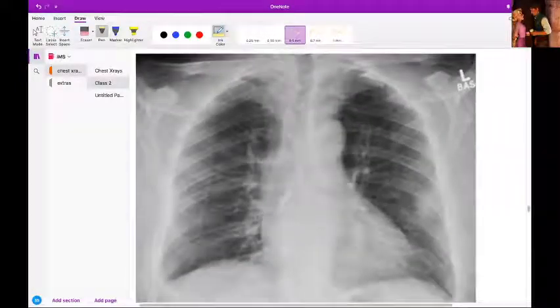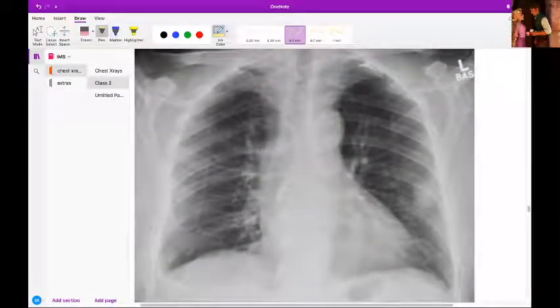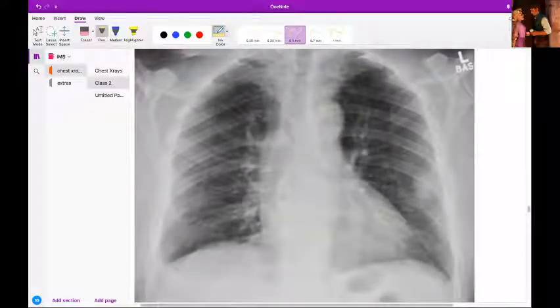Now what about this? Where do you see the nodule? Left middle, correct. Do you see anything else? Very small, subtle things. What would you say? Is this probably benign or probably malignant? Do you see any features of malignancy in this one? It is not calcified, that's correct. The ribs are relatively okay.